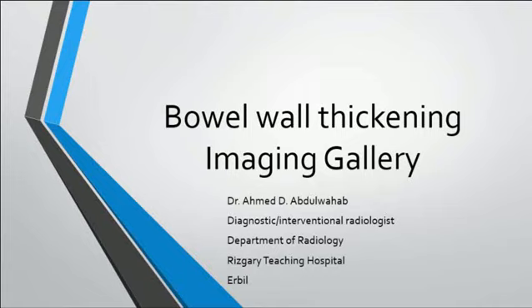Today we are going to talk about an imaging gallery of causes of bowel wall thickening. For the first instance, someone might say bowel wall thickening has a lot of differentials, and all of them look the same. But no, not all of them look the same. There are some differences. We're going to talk about it in the following.